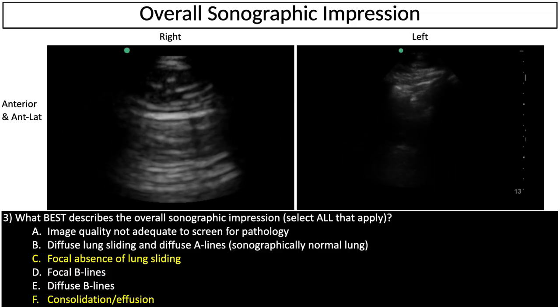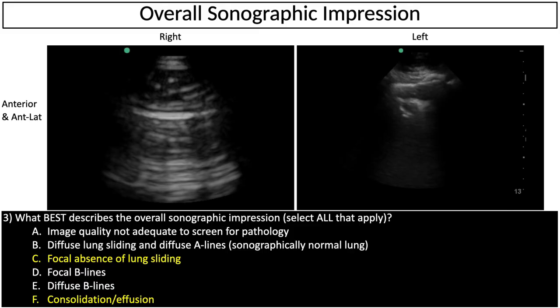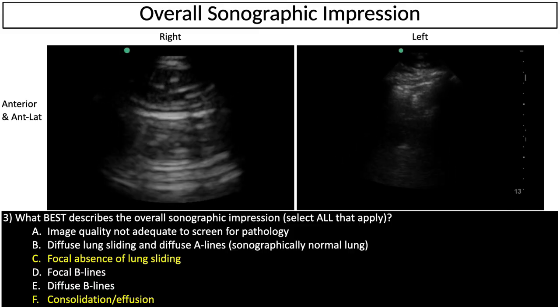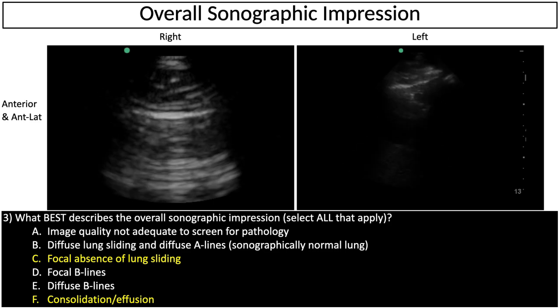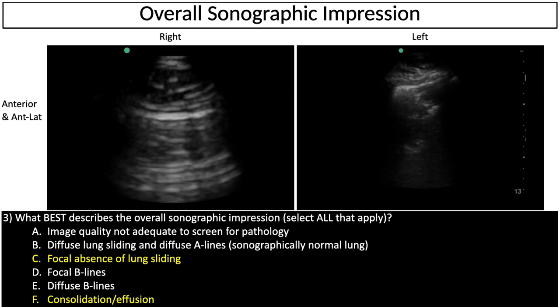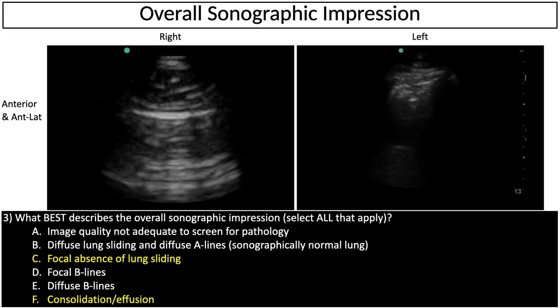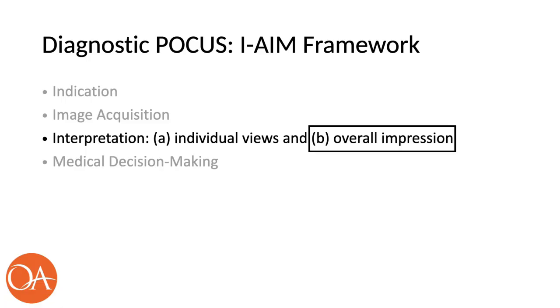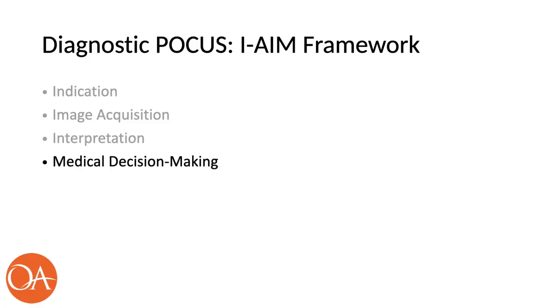In the presence of lung consolidation, it is common for lung sliding to be subtle or absent. This is because lung sliding disappears with loss of regional ventilation, and regional ventilation is abolished by the two main conditions associated with sonographic lung consolidation, atelectasis and pneumonia. Now that we have narrowed the differential diagnosis primarily to lung consolidation, let's now discuss how the anesthesia and ICU teams were able to integrate the ultrasound data into their medical decision-making.